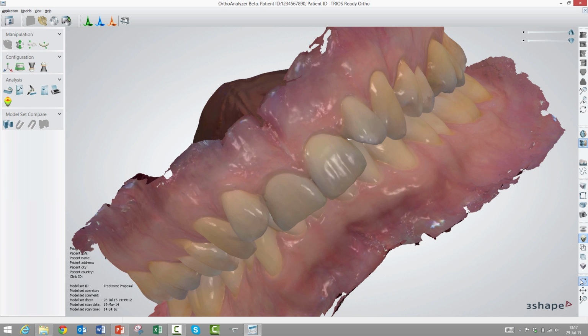As you can see, the very lower end here, I have three ways to operate the right side of the mouse. The first thing here is what we call rotate view. The second thing is what we call pan view, and the third thing here is what we call zoom view. Rotate view is default. That's what I've just been demonstrating.